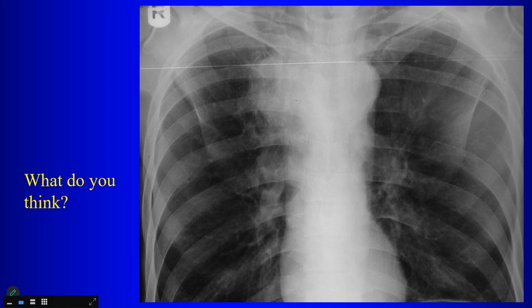Bobby, come on, there's an obvious problem here. Right upper lobe opacity. All right, this is big. You're going to call that an opacity or something else? Mass. Yeah, there's a big mass here, right? Kind of paratracheal, large mass. So what do you think that might represent?